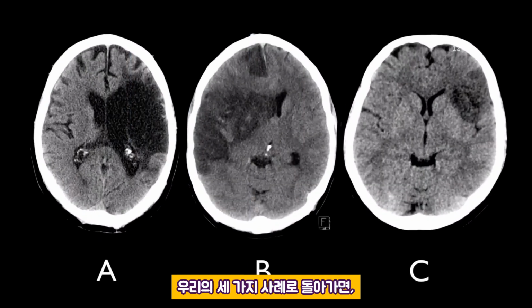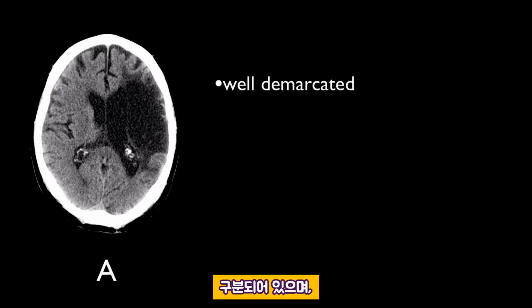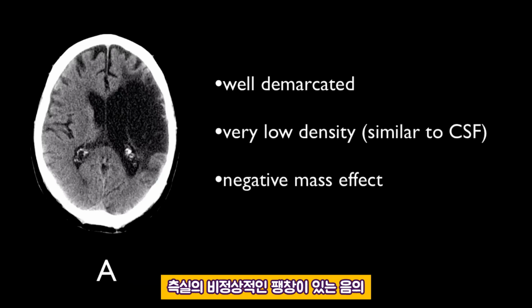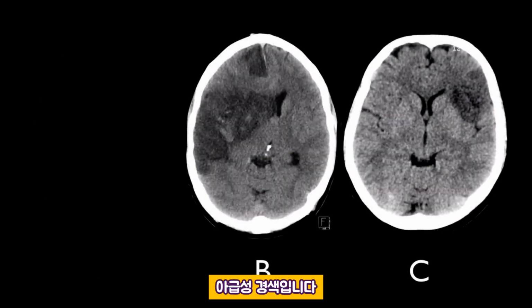Going back to our three cases, it should now be obvious that image A is of a chronic stroke. The region of infarction is very sharply demarcated and is of very low density, similar to that of CSF. And most importantly, there is negative mass effect with widening of the adjacent sulci and ex-vacuo dilatation of the lateral ventricle.